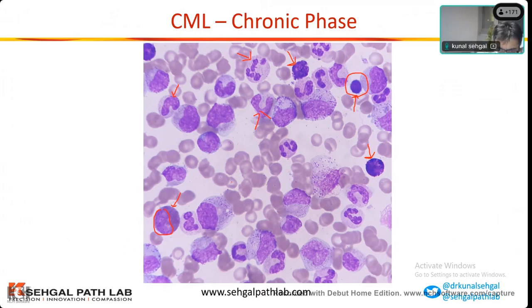Dr. Harini, what is this cell? Myelocyte. A little off over here, so maybe a promyelocyte. Promyelocyte. Excellent. So sometimes it is difficult to differentiate. If you have a nucleolus or a hof, we label it as promyelocyte. If there is no hof or a nucleolus, we label it as a myelocyte. Okay. So now, all in all, this patient has a high WBC count, normal platelet count, leukocytosis, left shift, and basophilia. What are we dealing with?